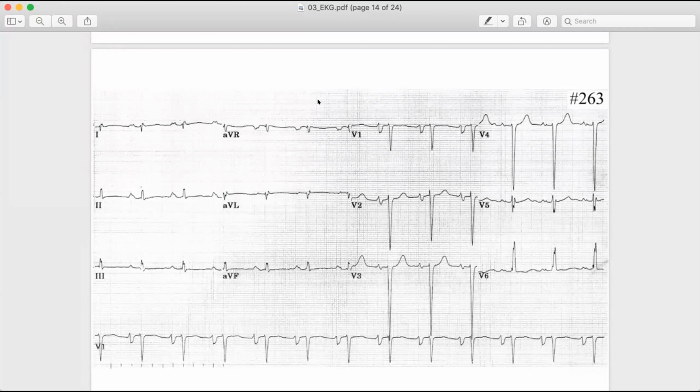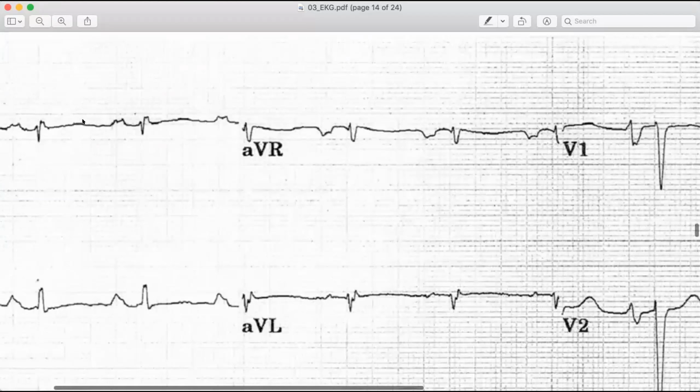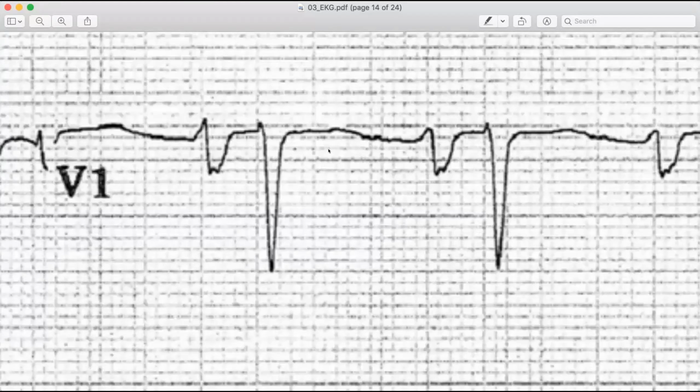But what's interesting is that if you look at lead 2, you can see that the P wave has an interesting shape. It's more pointed on the beginning side, which means that the right atrium is more enlarged than the left atrium. Can you enlarge V1? In V1, do you see that the initial phase is okay, however the terminal phase is deep and wide? Left atrium, yes. Exactly.